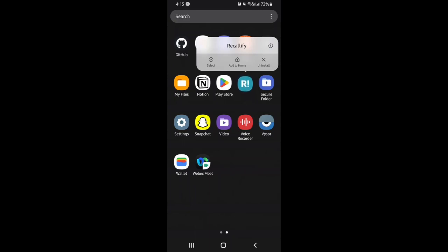I am one of the developers at Recallify Team Techno, and I'm here to demonstrate our application, its core features and components. Firstly, what is Recallify? Recallify is a productivity application for individuals in the early stages of traumatic brain injury. We hope to provide our users with cognitive rehabilitation exercises backed by extensive research to aid in the ongoing treatment provided by a medical team.